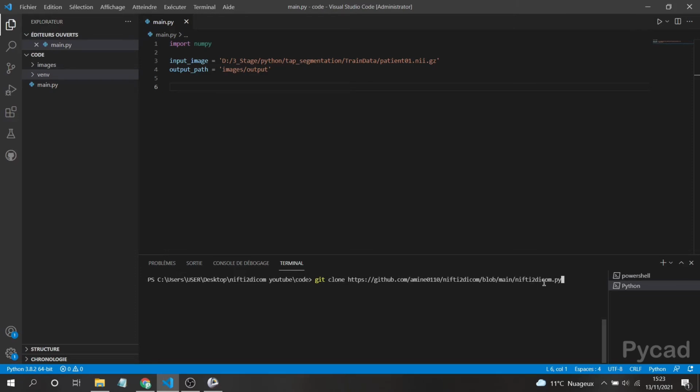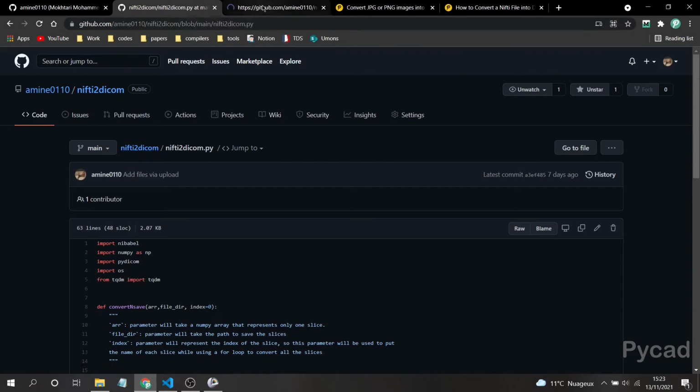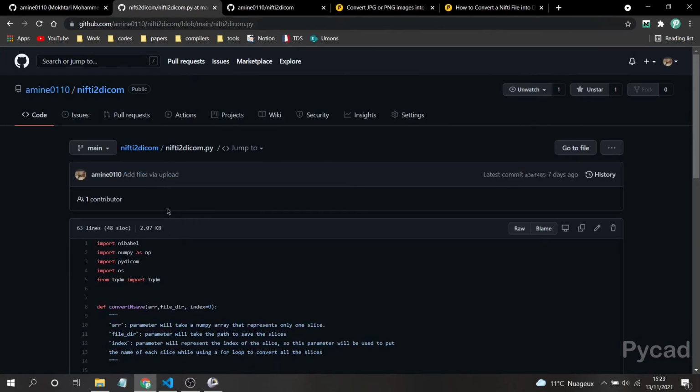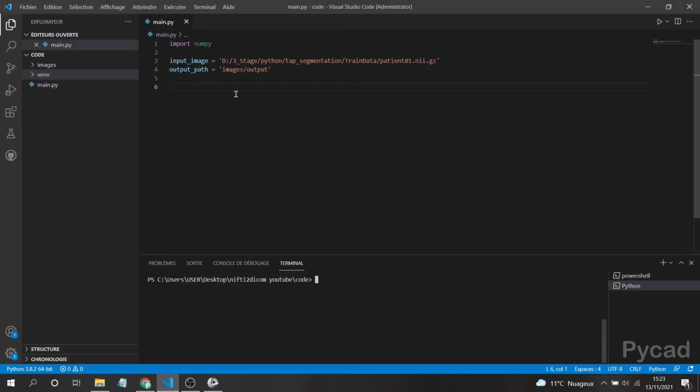Sorry, there is something wrong. There is a problem here. I took the wrong link. You need to take this link because here I am in the Nifty file. I am not in the repository, I am in a file in the repository. So you need to take the link of the repository and not of the file, sorry about that. So this is the link of the repository.